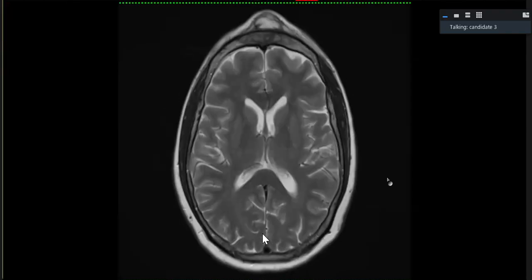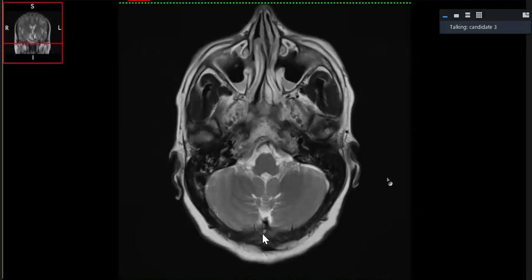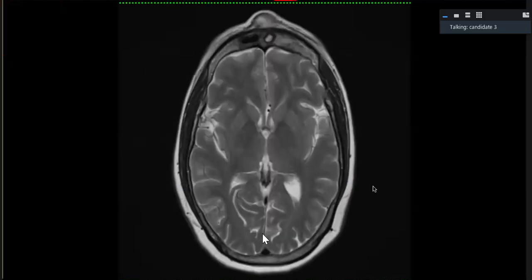So in a 68-year-old patient, to conclude my findings, I would also like to have a look at diffusion and post-contrast images. Other than that, I can also see there is fluid opacification of mastoid cells and some sinomucosal disease as well in the rest of the paranasal sinuses that need to be further evaluated, if the patient has pain in this swelling and a history of fever or any sinus disease which was pre-existing before trauma.